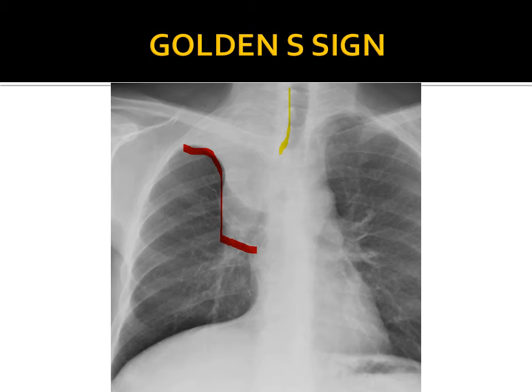So the most common cause of a central obstructive lesion producing this kind of appearance is an endobronchial tumor, which is most commonly squamous cell bronchogenic carcinoma. So we should also look for rib erosions because they may lead to lytic erosions of the ribs, and lymph nodes, that is hilar enlargement on the contralateral side.